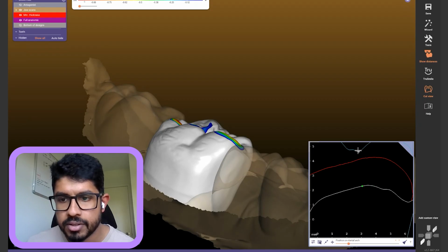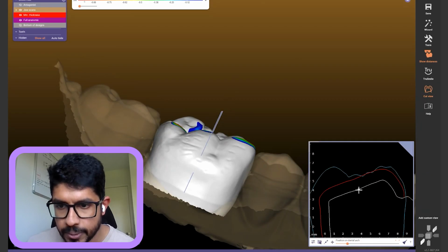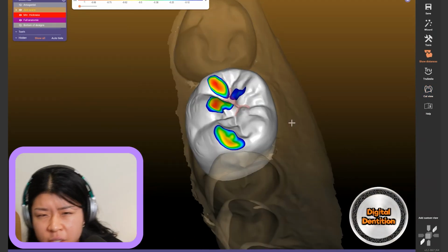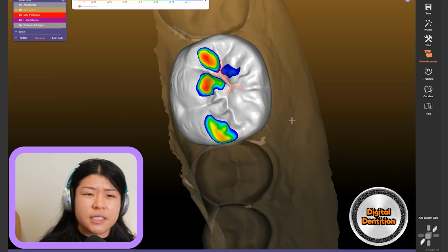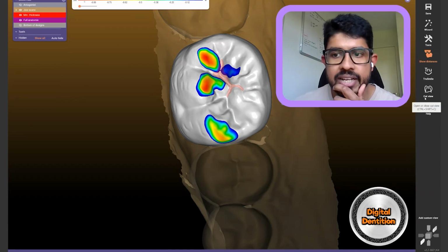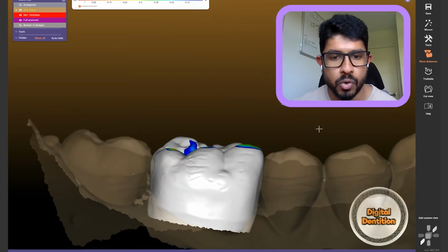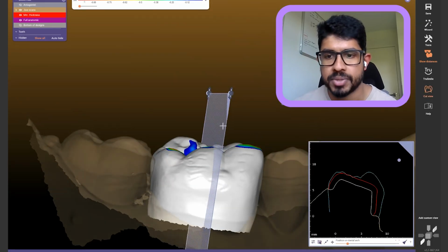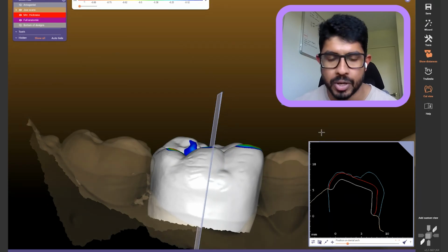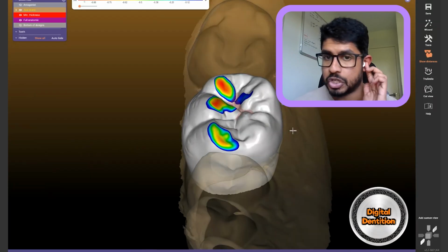which I think is just the measurement angle. Okay, there we go. Yeah, 1.2. That's what we got. It was just a weird angle that I did the cross section. When you were toggling that button to see the cross section, was that the Control Shift C? Correct. The Control Shift C that you see over here. I choose the view that I want, Control Shift C, and I drop this little tool over here so I can choose my cross section, and I can measure things as I go about. But again, the more you do this, you will feel like there's no reason for you to even use that.